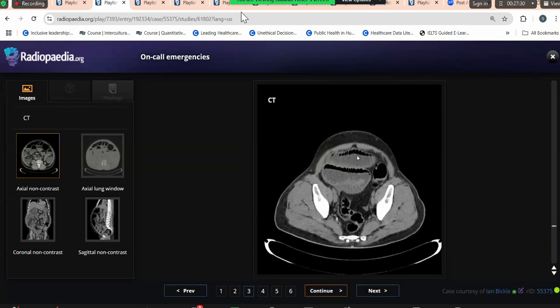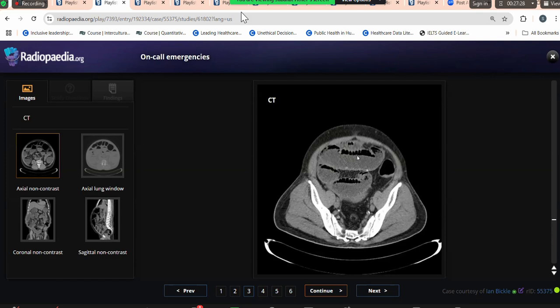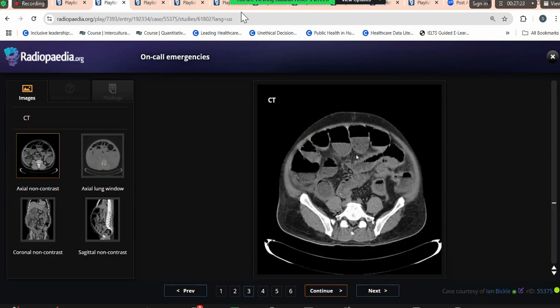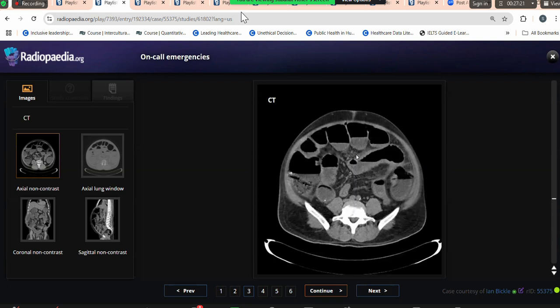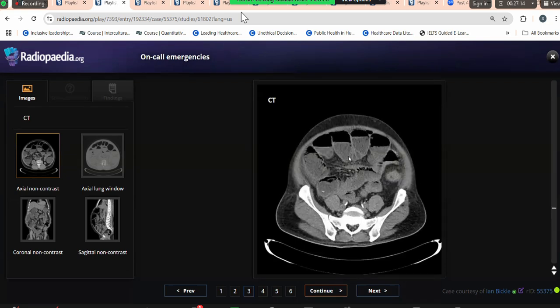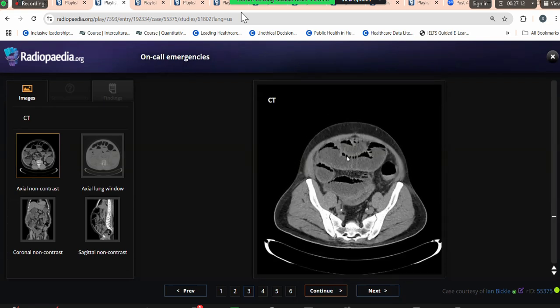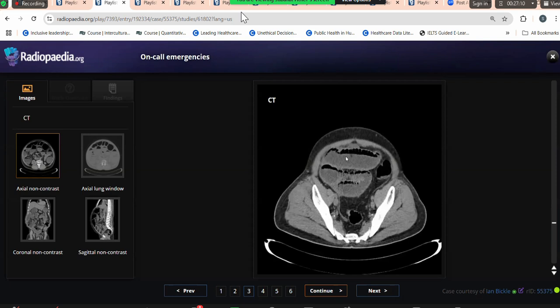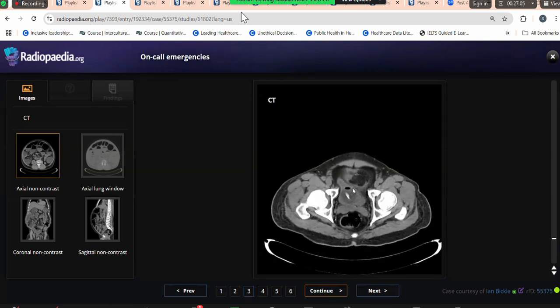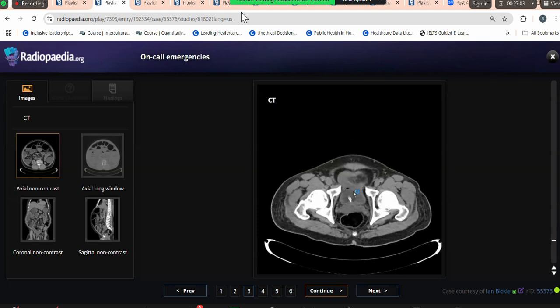I'm going back towards the large bowel. There appear to be some hyperdensities noted. Can you show me the large bowel, Candidate 4, with the arrow? The dilated large bowel which you are tracing.